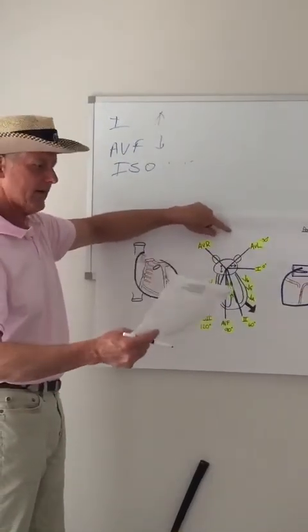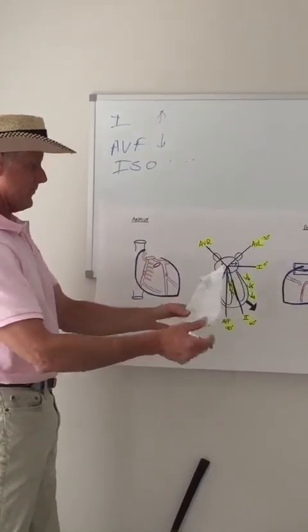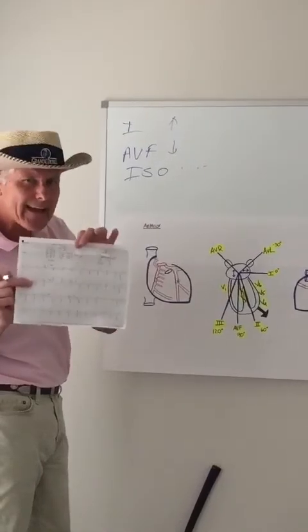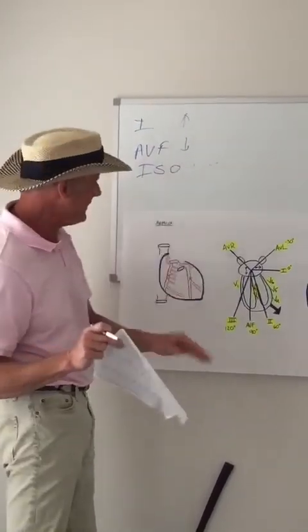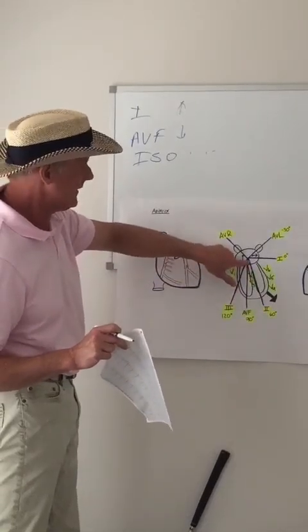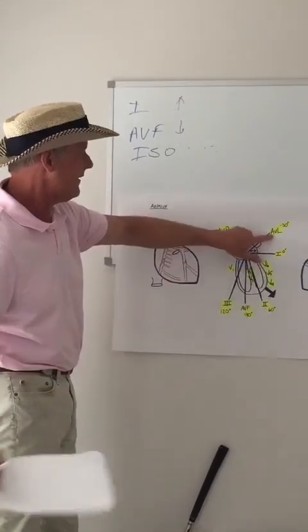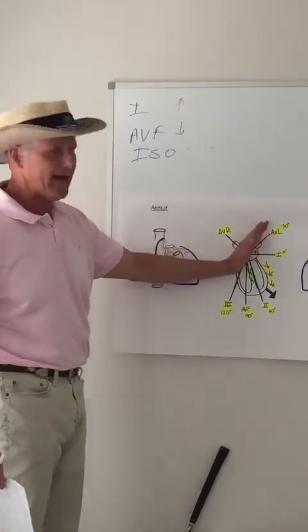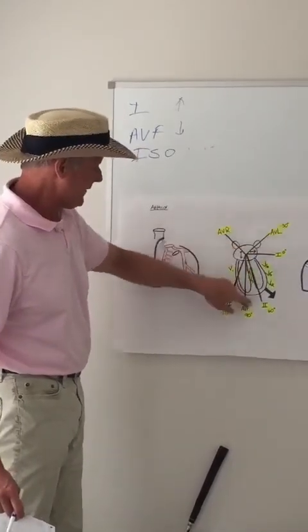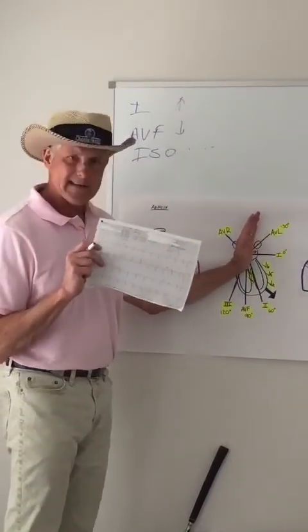Then we find the isoelectric lead, and we can't quite find it. But it's very close to isoelectric in lead 2, just a little more negative, so it's a little north of lead 2. What is 90 degrees perpendicular to lead 2? Well, 90 degrees perpendicular to lead 2 is AVL, but it's a little north of that. And Will said a normal axis is minus 30 to plus 90. This is just north of minus 30.